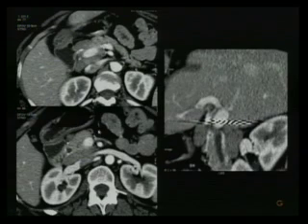pancreas. This was another case with a diagnosis of pancreatic carcinoma by PET-CT. We see the CT scan, and we noted that the pancreas was okay, well delineated, with the SMV, pancreatic duct, biliary duct, duodenum, and SMA.